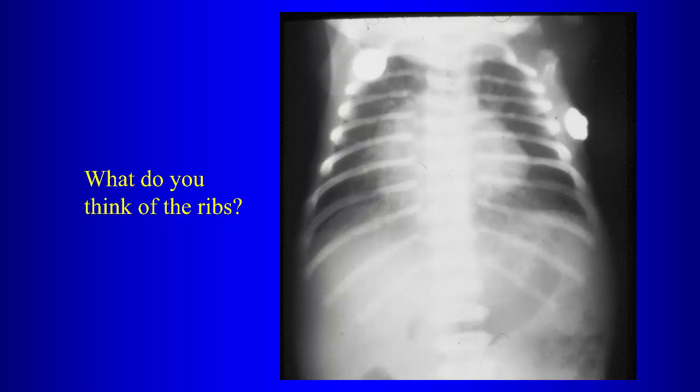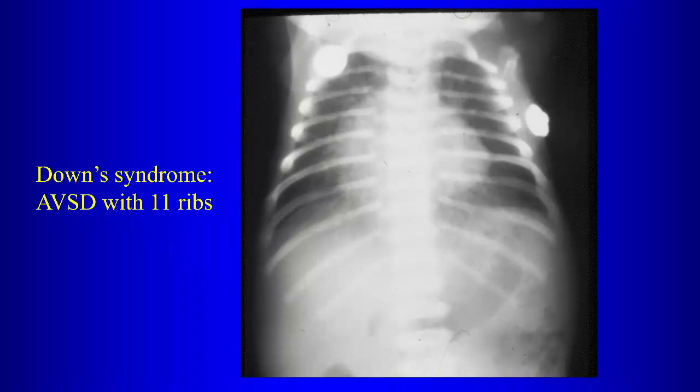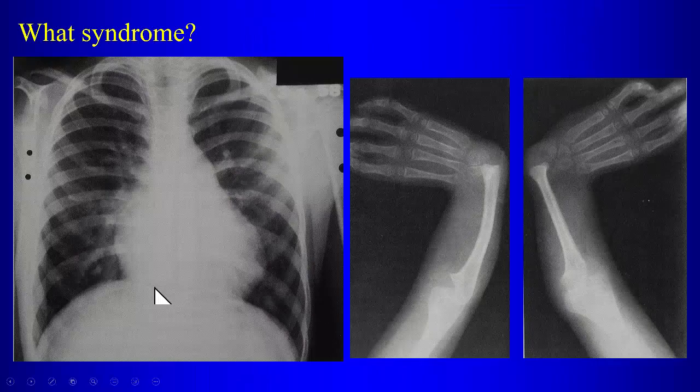Yes, right. So too few ribs or too many ribs can be associated with Down syndrome. And what congenital cardiac malformation is Down syndrome associated with? ASD and VSD, that combination. So those are called what? Endocardial cushion defects, right. So abnormalities in the number of ribs can be associated with endocardial cushion defects in somebody with Down syndrome.